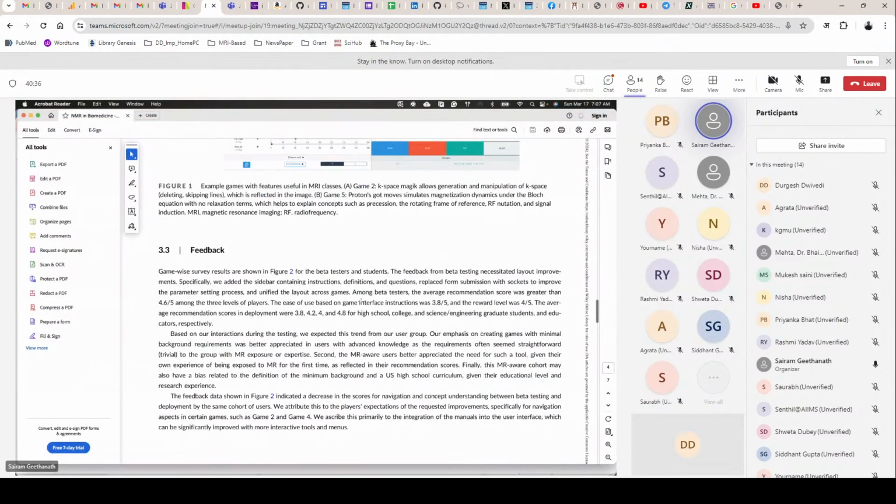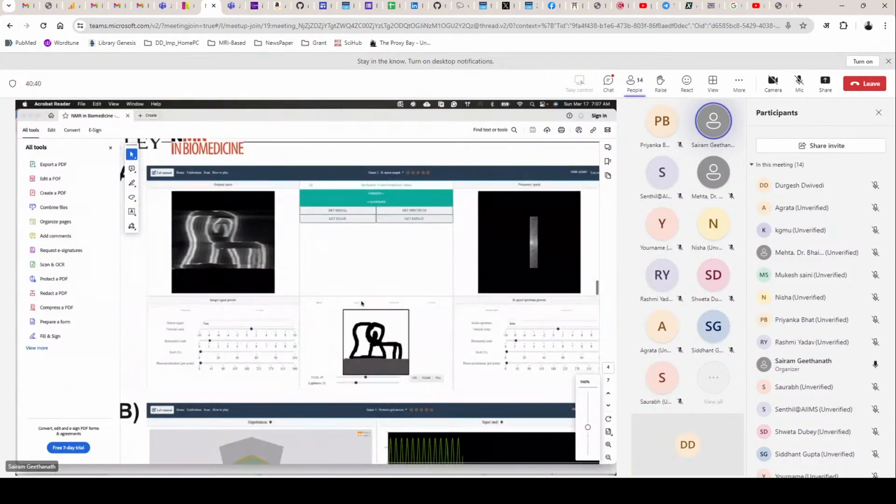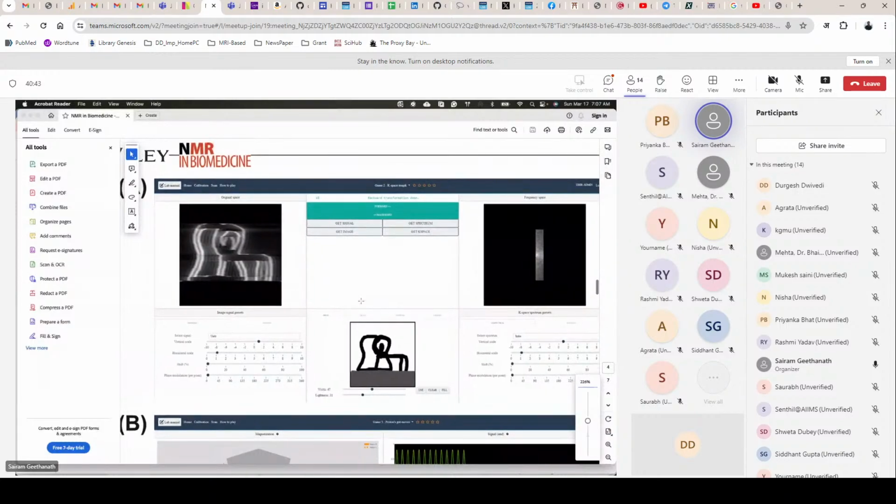Just quickly, here's another demo where we're looking at K-Space Magic, where you can actually draw your own object. You can doodle whatever you want. Basically you doodle here, and then you can apply filters to your doodling. It will make an image, and on the right hand side you can draw your own filters, which is basically how much of K-space you want to keep, and that will show you the effect of two things. One is the Fourier transform pairs between the image domain and K-space, and also some level of image processing itself in terms of low pass filtering, high pass filtering, and the like.